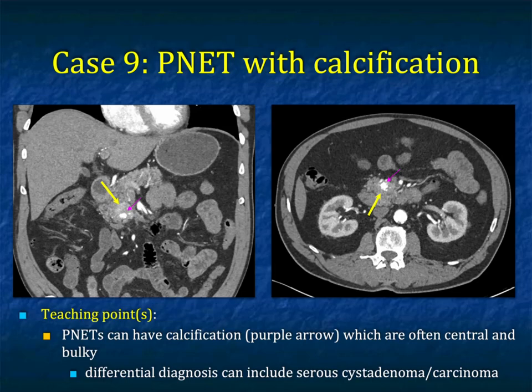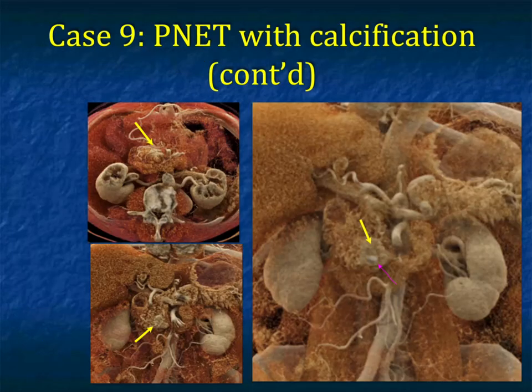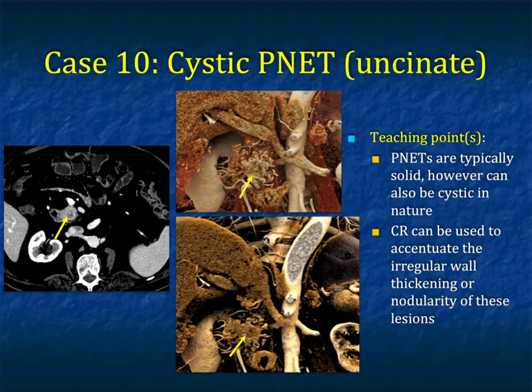There are multiple calcifications. Now, with the appearance of calcified pancreatic lesions, I always think first about neuroendocrine tumors, serous cystadenoma, particularly central calcification, MCNs, peripheral calcification, and if you think about SPEN tumors, they can have a range of appearances. In fact, SPEN and neuroendocrine may be the ones that overlap the most. But again, a nice example, and you could see it here again with the cinematic rendering, the vascular lesion, the areas of calcification. Most cases of neuroendocrine tumor like this one do not have pancreatic duct dilatation, but we'll come back to that in a moment.